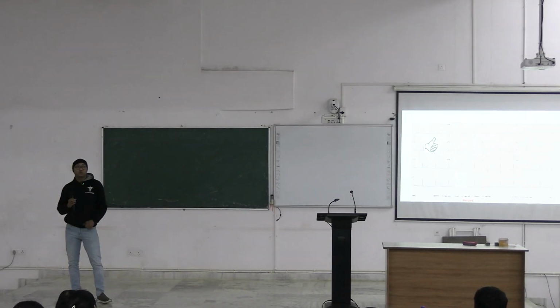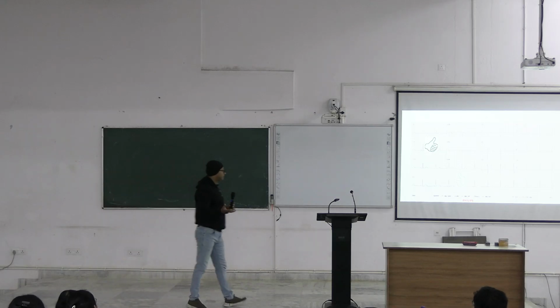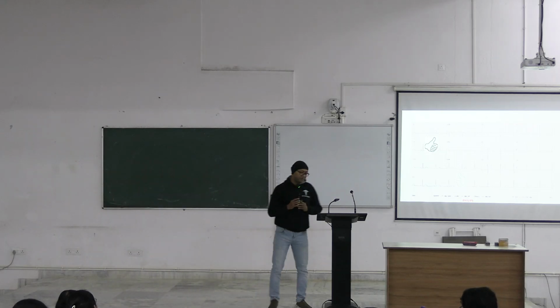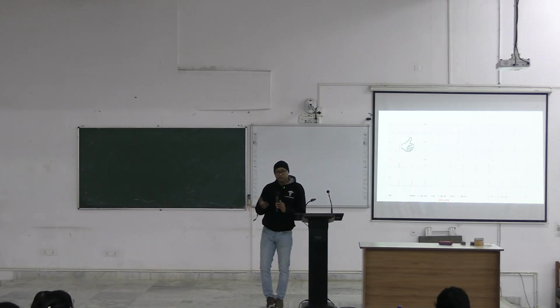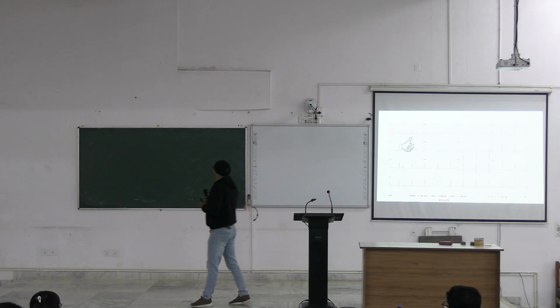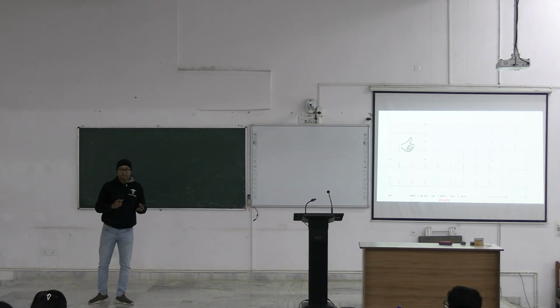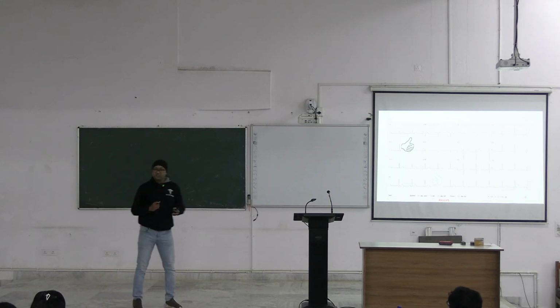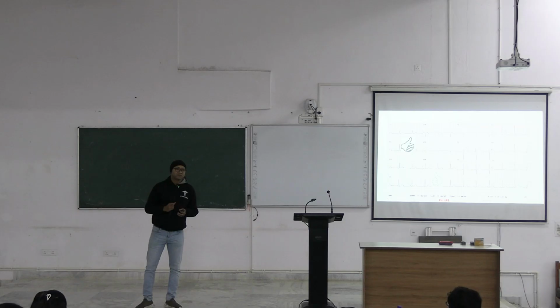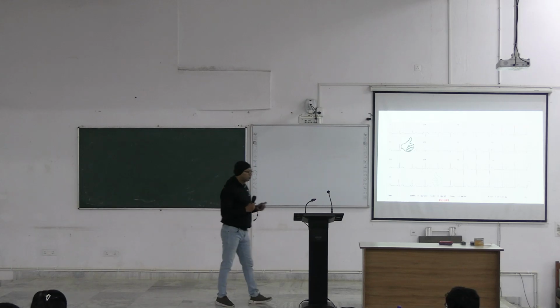But if I ask you what is the exact axis or what is the angle of the axis, which is a very important question at your first professional MBBS examination, maybe it will be asked in practical examination, or maybe it will be coming in your theory exam as well, right. So, determination of actual axis in degrees. What is the normal axis range? Minus 30 to plus 110 degree is the normal axis.